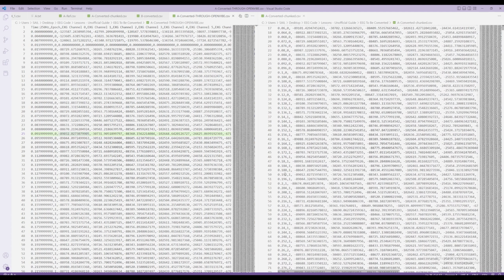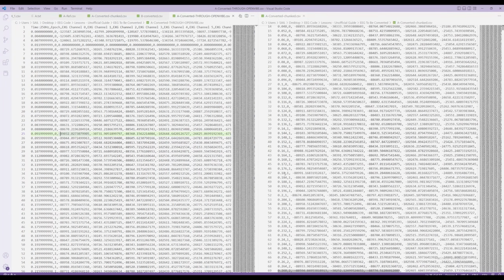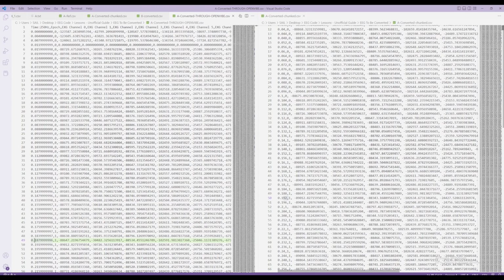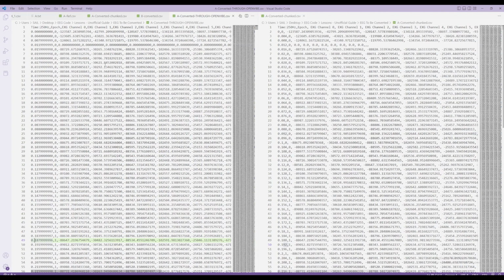But other than that, let's compare our timestamps. So 50th line, 50th line. Ours is kind of rounded up, and OpenVibe's is a bit different. So this means that every time OpenVibe passes the file through, the timestamps are dumped and regenerated. This is good news, because that means you can easily regenerate them. But it would be nice if it was able to also keep the original timestamps. But this is a very robust system, and it's easy to figure out and make it work.